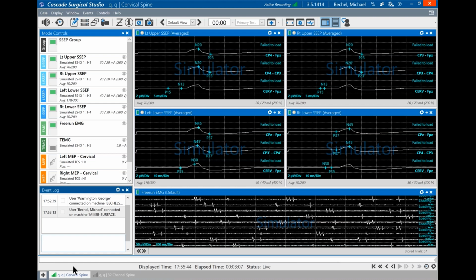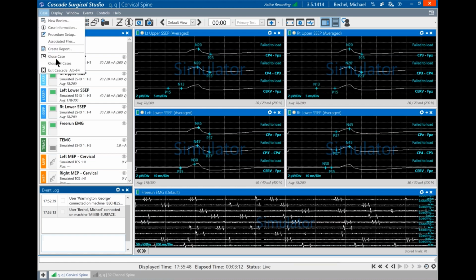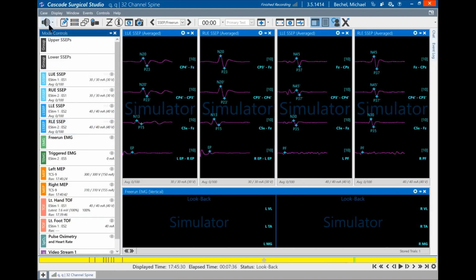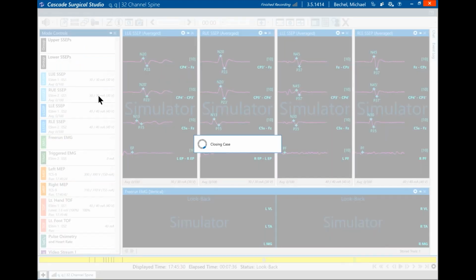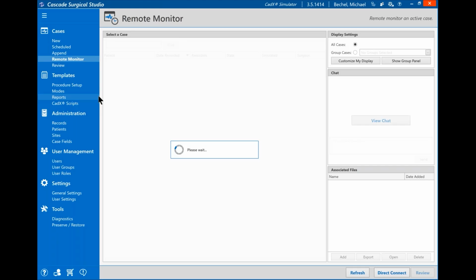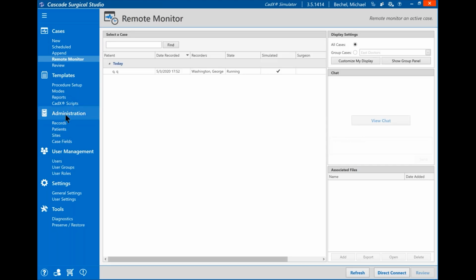User management, as we discussed, if you make these changes and let's say you've got 20 people that you need to manage, you can add all those people to your user list. And when they're added, CADLink would then synchronize across all of your systems, all those different clients that would connect to this, all of those users and what they're allowed to do. So you don't have to go around from device to device and synchronize that.